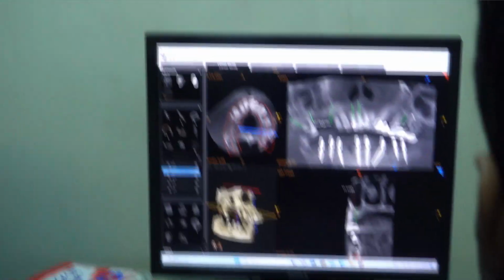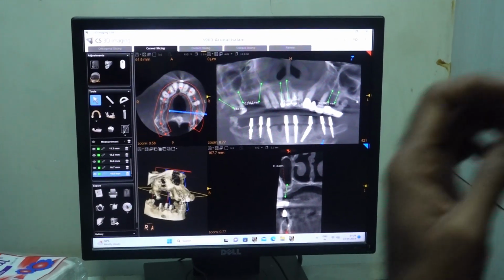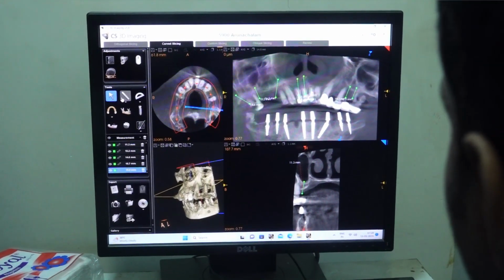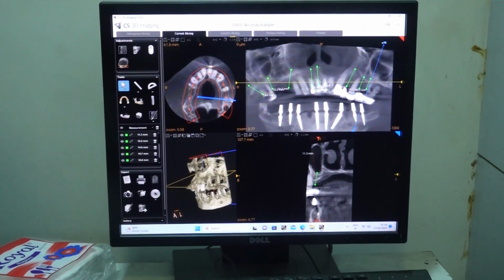There are some additional things, they are not important. Okay. We will see pterygoid. Possibly we will place pterygoid, otherwise we will place it. So one implant in the first premolar and another implant in the mesial aspect.